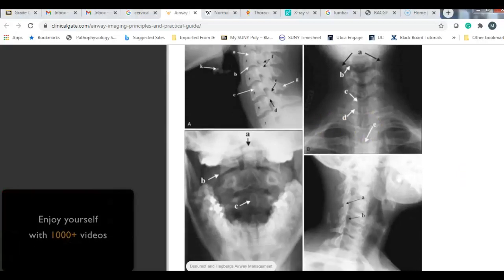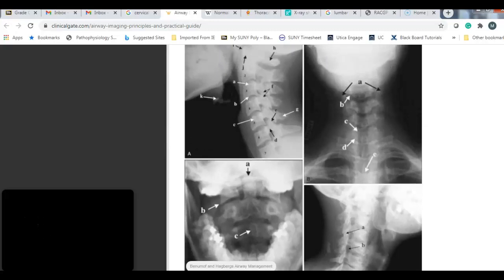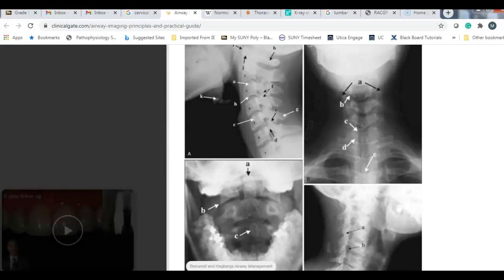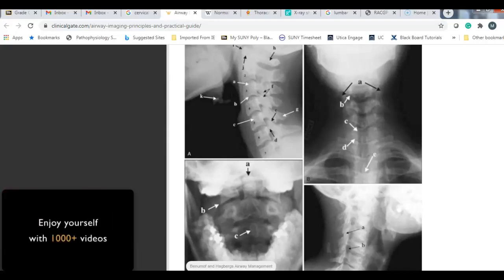And then that's another lateral view down there. If you continue with that trauma series, you would actually then also have oblique views. So you can make sure the alignment of the vertebra are good that way. And you could look to see where the space is where the cervical nerves come out and make sure that they're patent and open. So I know I'm giving you a ton of information. I'm probably blowing right over, but let's go back to the basics.